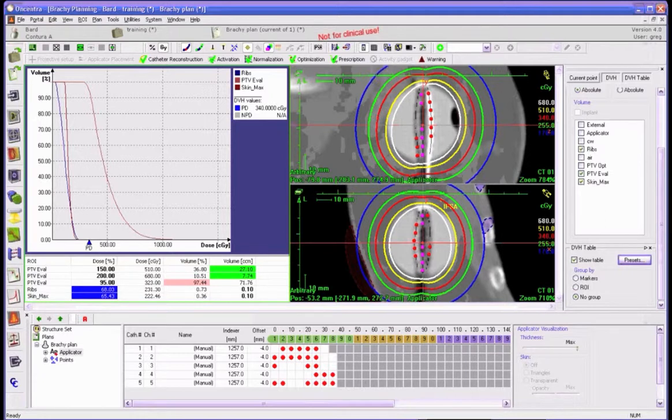The hot spots here, the PTV V150 here and the V200 here, remember we said we want this below 30, which we've achieved, and we want this below 10, which we've also achieved, so they're within the range, but they're probably higher than they need to be. And if we're trading off coverage here versus these, we have absolute maximum for, but we know that we want them as low as possible. So if we can give up a little bit of this to come back to about 95%, we can make these even lower so that the homogeneity within the volume is a little bit better, and we're over-treating less breast.